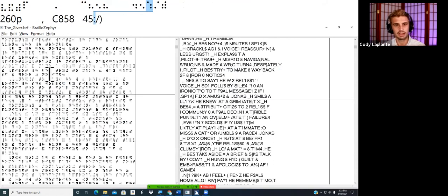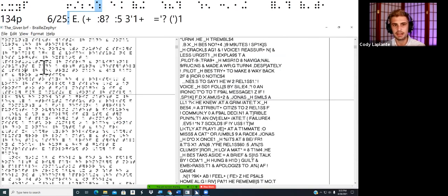If I click in here, you can see that the text still doesn't look very nice, but the Braille is nice and untranslated. Well, it should look as it does on the BRF file. For some reason, it's not showing it the way it should, but that can be something that we come back to. Yeah. So let me show you this with NVDA as well.